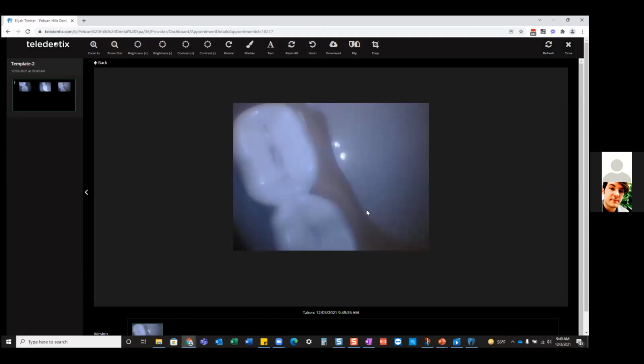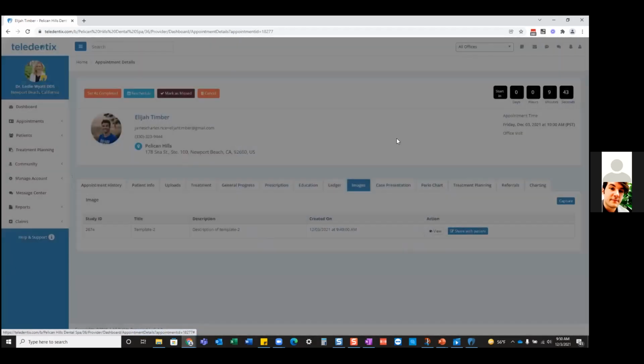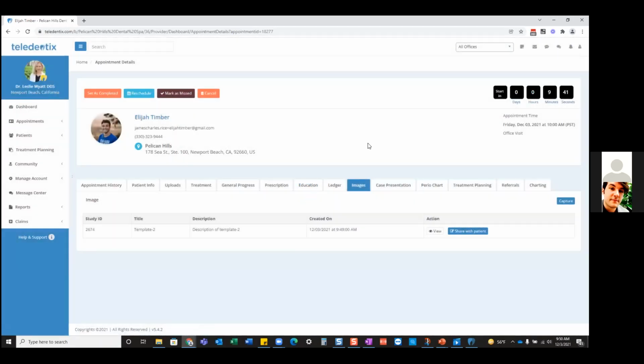I'm going to go ahead and just click on the image here, and here we have pretty much the same features that we just reviewed. Okay. All right. Let me go ahead and save that. And then I'm going to close. Okay, there we are.